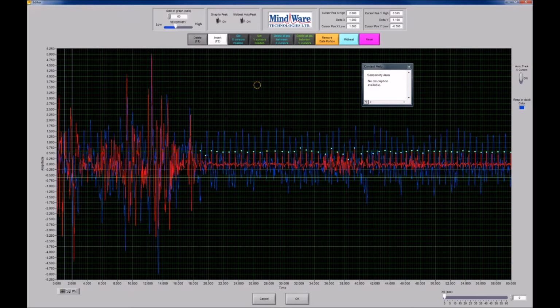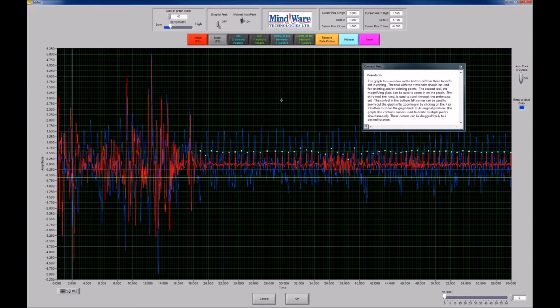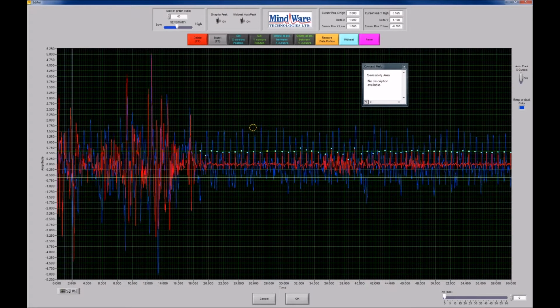Now, I should mention that this is a new feature for the 3.1 version of the applications. So if you're using the 3.0 applications, you're probably used to seeing something like this little crosshairs. And there's no way really to make that bigger or smaller, but the sensitivity scroll bar will still adjust generally the same thing. It's just in the 3.1 applications, we've added this circle to make it much more obvious what that sensitivity scroll bar is doing.